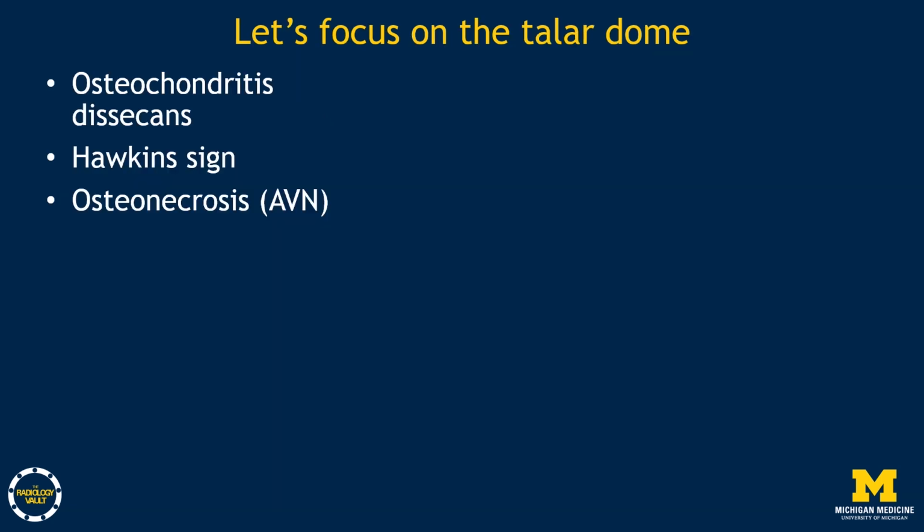Let's shift gears and focus on talar dome pathology. By convention, focal abnormalities of the talar dome are referred to as osteochondral lesions or OCLs.